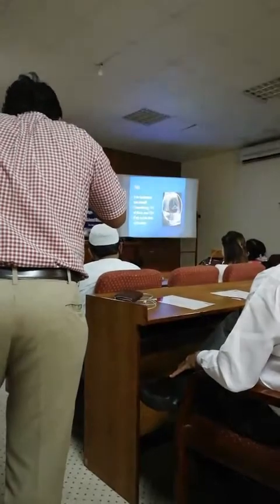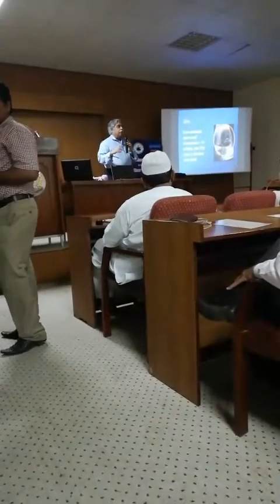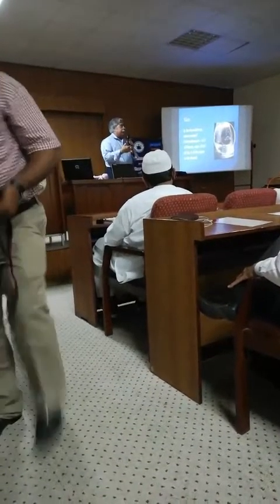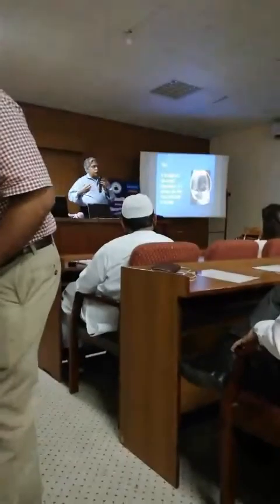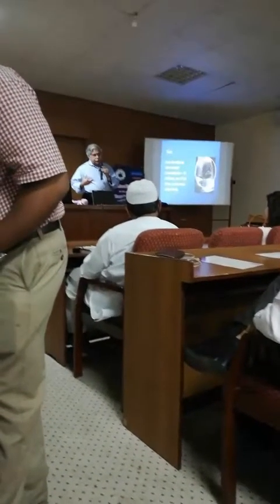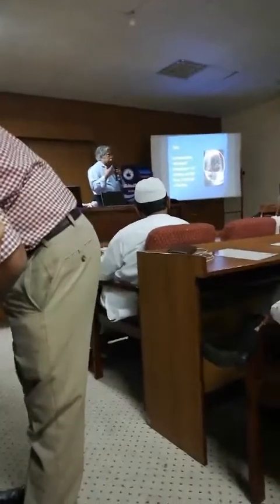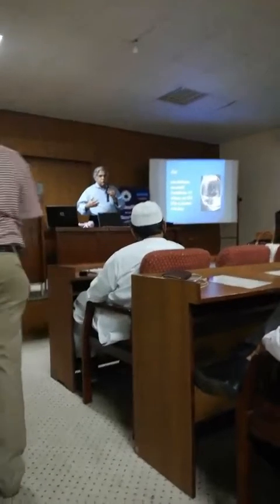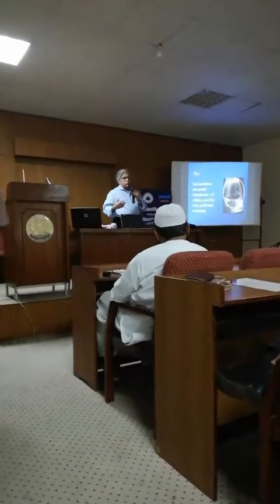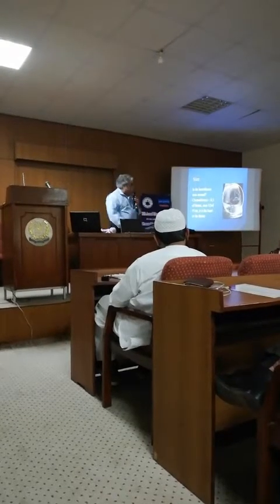Okay, so if the heart is not occupying 1/3, which generally means that the heart is occupying more than 1/3 of the area of the chest, then you need to diagnose whether this is a big heart in a normal chest or a normal heart in a small chest. Are you all following me? Yes. Good.